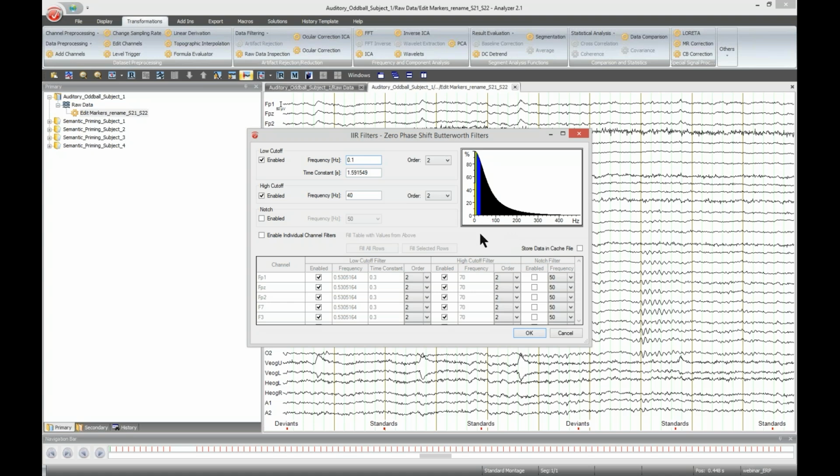So there is no straight division line between passed and suppressed frequencies, it's rather a gradual passage. You can see that very nicely in this filter response function, which has a rather shallow and long-lasting gradient towards higher frequencies. In case we want a steeper gradient of the filter function, we need to change the filter order.